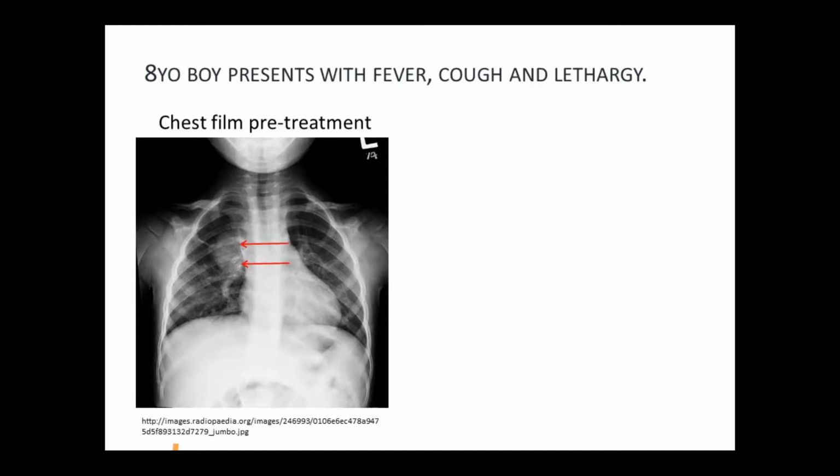The presence of an air bronchogram within an opacity lends itself to the diagnosis of a bacterial pneumonia. An air bronchogram is when a normally dark, air-filled bronchus is made visible by the opacification of surrounding alveoli. Round pneumonia is most commonly present in those under 8, is located in the lower lobe, and is present without any other chest wall abnormalities.